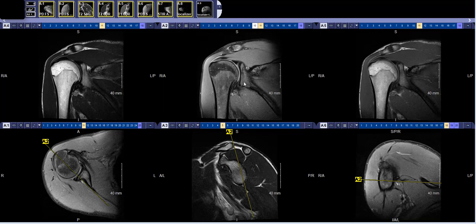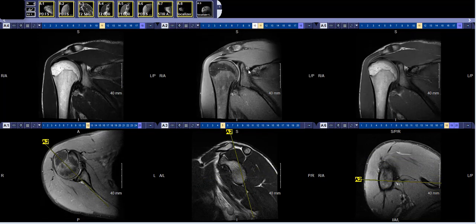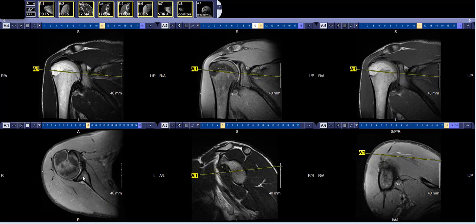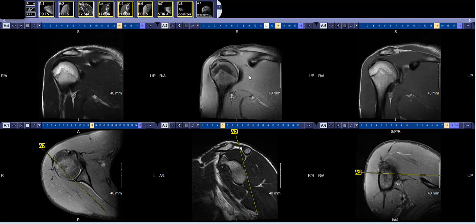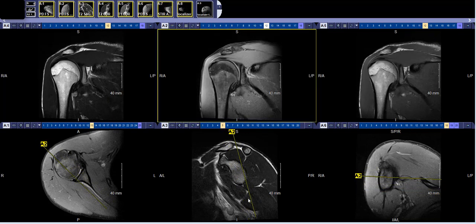After joint fluid, I'm also looking at the alignment really on the axial and the coronal, just to make sure the glenohumeral joint's appropriately aligned. A little bit of posterior decentering of the humeral head's not all that uncommon given that the patient's lying supine. But certainly if you see superior migration of the humeral head, if it's moving superiorly towards the acromion, that's not normal. And will clue you to maybe some sort of chronic underlying tear. Usually there's a chronic underlying tear to go along with that.